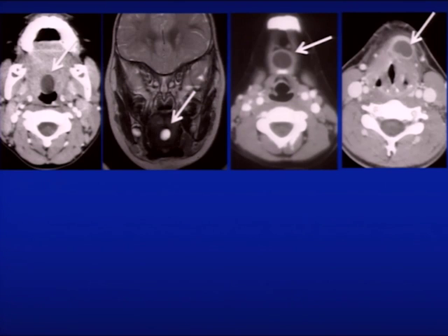Here's one, though, that has a thick rim of enhancement. The fat around it is edematous. This one presents with cellulitis, acts infected, and turns out to be an infected recurrent cyst in a kid who had a previous Sistrunk procedure.